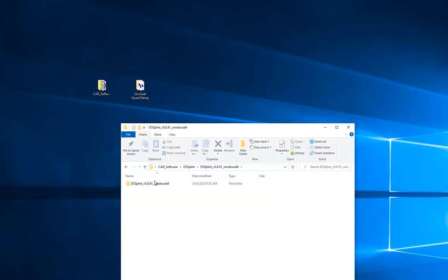This is the folder that I'm going to run the software from. I would make sure that you do not have this in Dropbox. I use Dropbox a lot, but you want to have this locally saved on your computer. So if you're using it on a couple different computers, put it on each of them on the actual desktop. I have it on my lab computer in the office, and on my laptop and my desktop. You want to have it saved locally on your machine, otherwise it can run into issues.